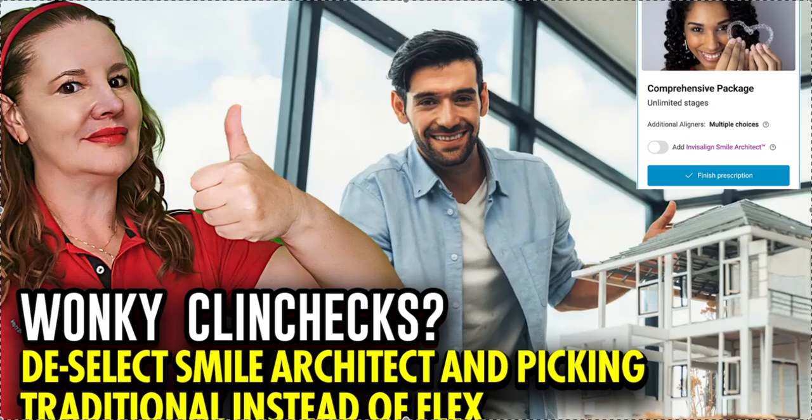I have zero answers. All I know is that now the Smile Architect is a default as you submit a case. And so is the Flex. So this is new. Before it was like Flex versus traditional, and Smile Architect you had to opt into. Now it is the default. You have to untoggle it, or at least it is on mine. So anytime I've used this as a default, not good. So I'm not a fan.